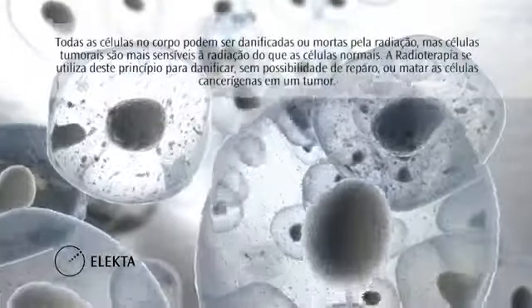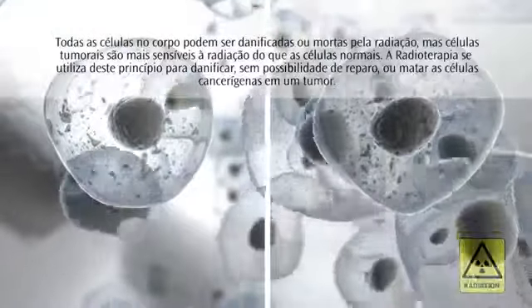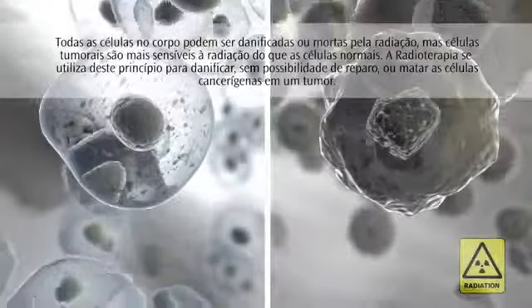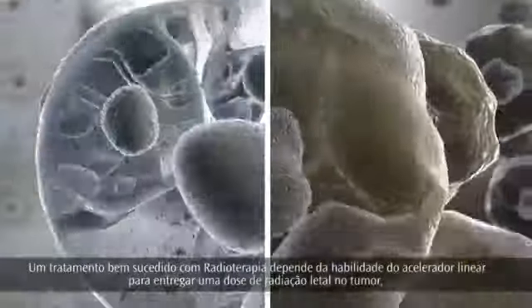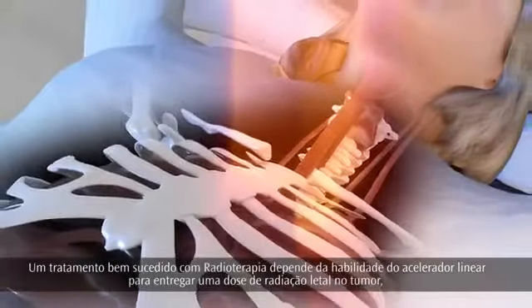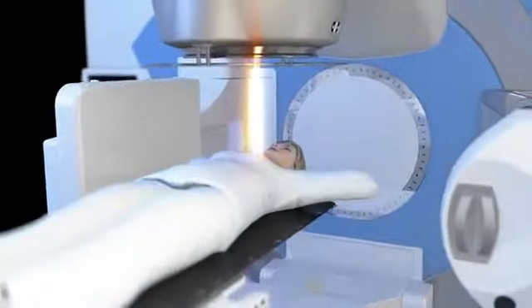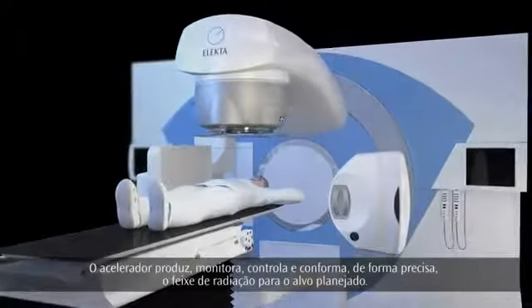All body cells can be damaged or killed by radiation, but tumor cells are more sensitive to radiation than normal cells. Radiation therapy uses this principle to damage beyond repair or kill the abnormal cancer cells in a tumor. Successful radiation therapy depends on the ability of the linear accelerator, or LINAC, to deliver a tumoricidal dose of radiation to the tumor, while ensuring minimal radiation of normal tissue. The LINAC accurately produces, monitors, controls, and conforms the radiation beam to the planned target.